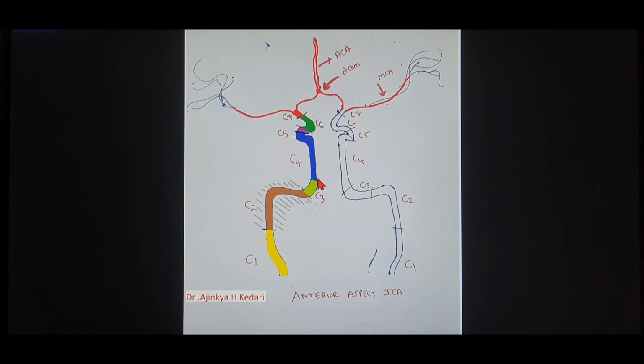Okay, so after that lateral part, we have the C4 over here. As you can see, this is the blue version. That's the cavernous part of the internal carotid artery. Now, this part of the carotid artery in the cavernous sinus is also called the carotid siphon because of its S-shaped curvature. Above the cavernous part, you have a very small segment which is also called the clinoidal segment because it is lying at the level of the clinoid process. That's C5. Then we have this C6.